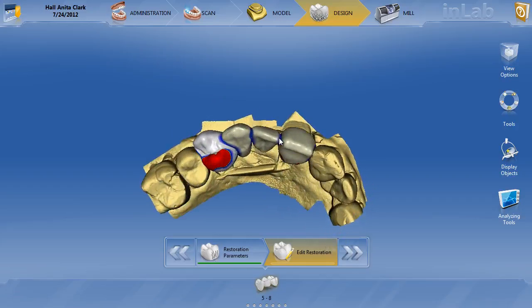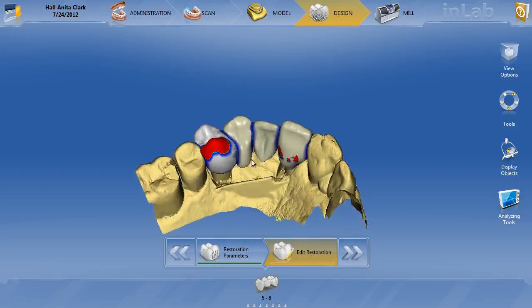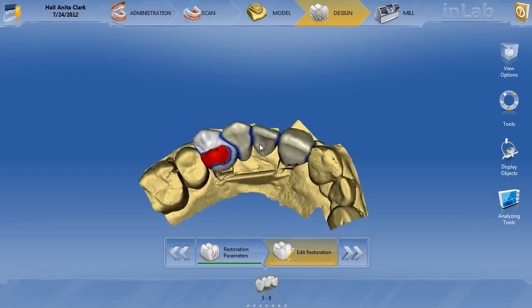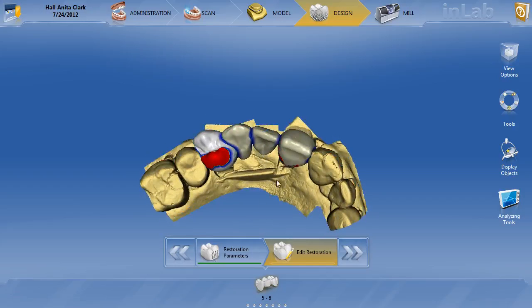There's a couple issues that I see. Number one, the model axis probably needs to be adjusted. If you review the model axis videos, you'll understand that that's very important with the proposals, specifically with bigger proposals that turn the corner. The other thing I can see is the Pontic bottom line needs to be much broader, so we'll go ahead and redesign this case. So let's go start over from the beginning.